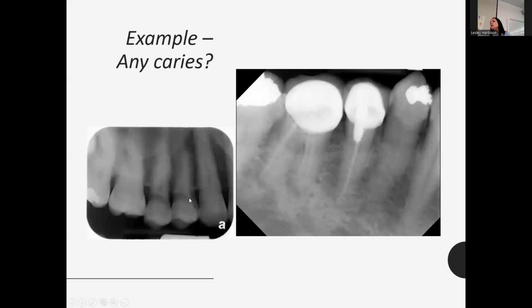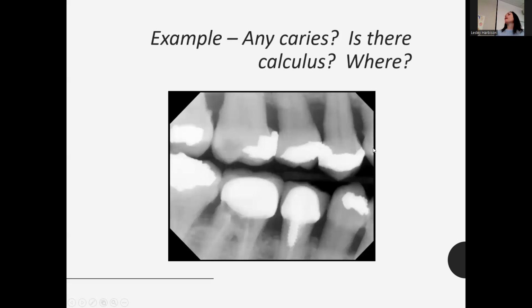Do you guys see, what do you see in this image here? Or the band. The band. Yeah, the abrasion. You can see the abrasion here. What about over on this one? This one's a really hard one to look at. Why would I put this one in? It has horrible foreshortening. I don't know why I'm. Unless this is abrasion too, maybe? Like maybe through here? I don't know. I don't like that one anymore. Okay, we're gonna move along.